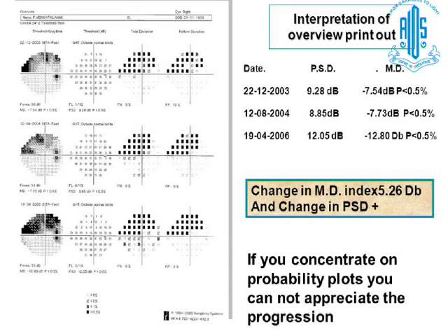Whatever you know, you will see. What you do not know, you won't see. So don't put a teacup on the grayscale. Grayscale is very, very important. It tells us the depth of the field defect at a glance, and that can be seen in the raw data, the total deviation numerical plot. So in this case, it is progressing, vertical progression.